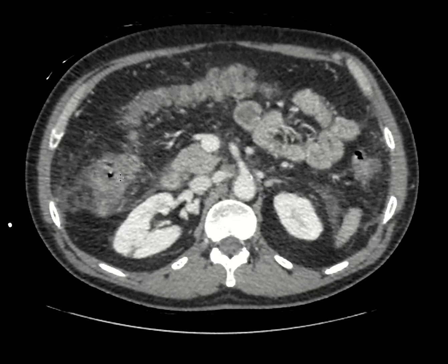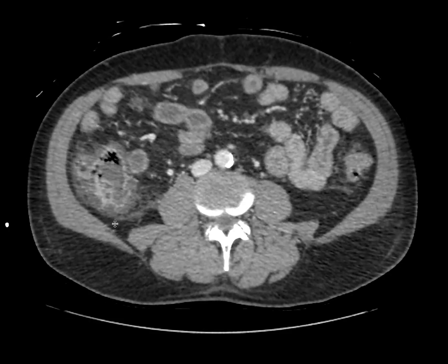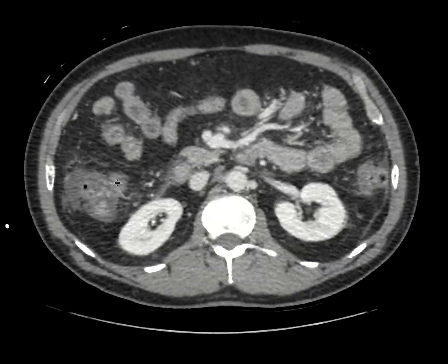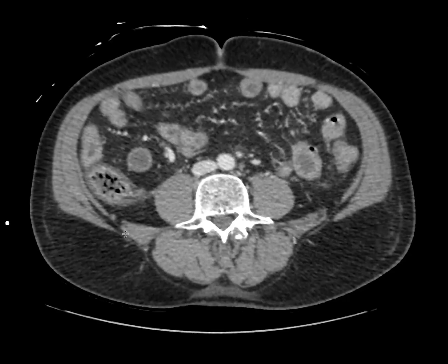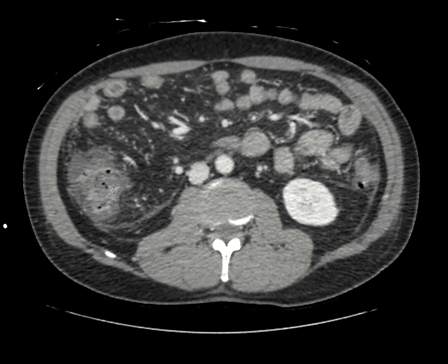Now, the other finding in this particular patient is that if we come down lower and we start looking at the colon, it looks like there's colonic wall thickening and edema and so forth. And so usually in a patient we think about colitis as something that can cause edematous inflammatory changes involving the colon. But in a patient who has portal hypertension, one of the things to think about as well is, could this be related to the portal hypertension?